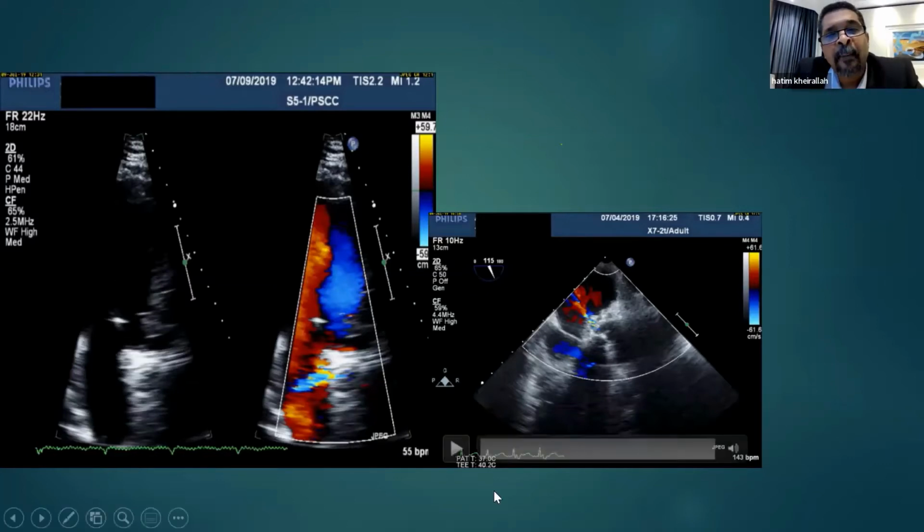And the other thing about the rupture or the aneurysm, in the aneurysm, you are not going to see a continuous flow like this. You are going to see a distorted anatomy, a very dilated sinus, like in here, but the color is uniformly going in the right direction.